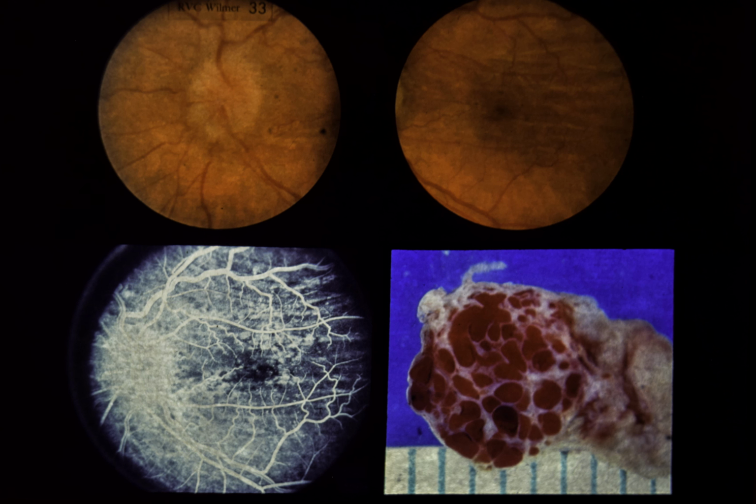Lower left. A fluorescein angiogram shows alternating areas of hypo- and hyperfluorescence caused by choroidal folds. The patient's reasonably good acuity, almost normal field, and long history suggested a diagnosis of orbital pseudotumor, and a therapeutic trial of steroids was given.